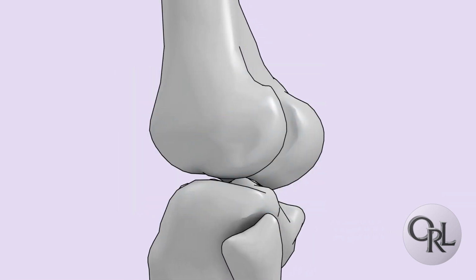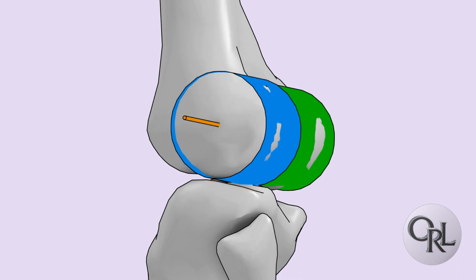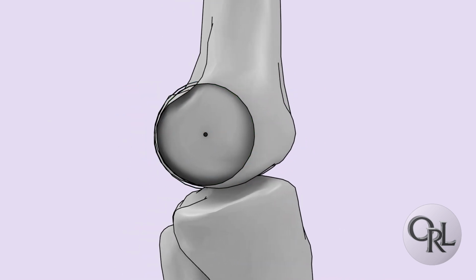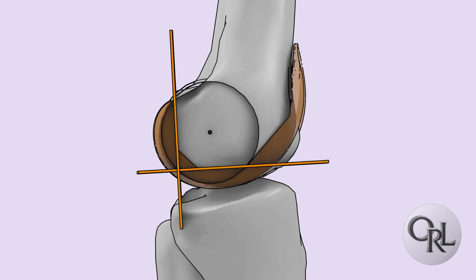to the mechanical axis. Kinematic alignment seeks to restore the joint line to the individual patient's pre-diseased state, referencing the flexion extension axis. This imaginary line passes through the geometric centers of each posterior femoral condyle. Equal resection, allowing for cartilage wear and saw kerf of the distal femur and posterior condyles, ensures that the resection surfaces are parallel to the flexion extension axis. When the thickness of the implanted femoral component matches the resected bone fragments, the patient's estimated healthy cartilaginous surface anatomy would be restored. The proximal tibial slope is resected to restore the individual patient's original varus and posterior slope.